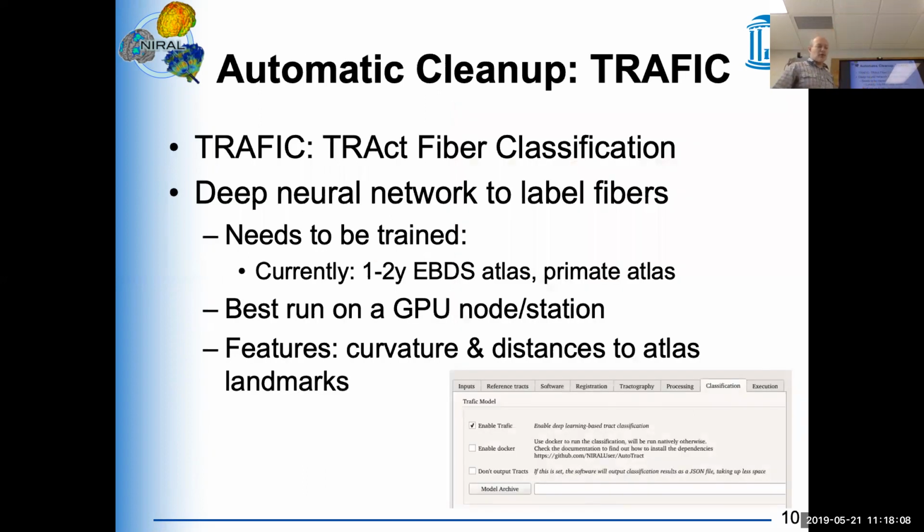The best way to get your best tractography parameters is to play around with your atlas in Slicer, just a few tracts, to see what tractographies you get with that setting. And if you're happy with a certain setting, that's the setting you can then use in that tab.